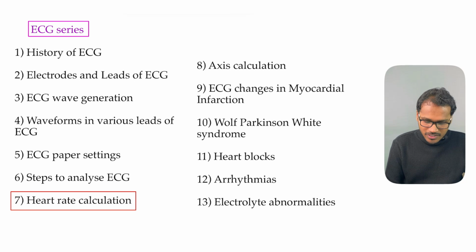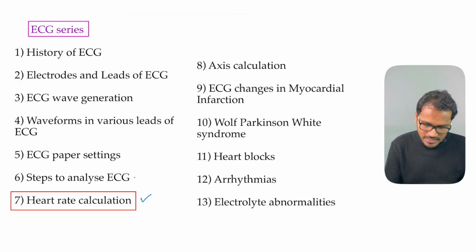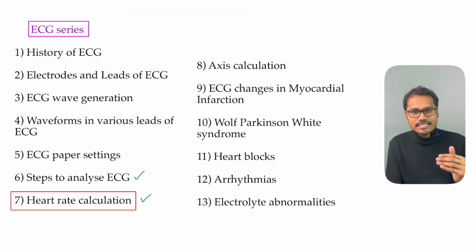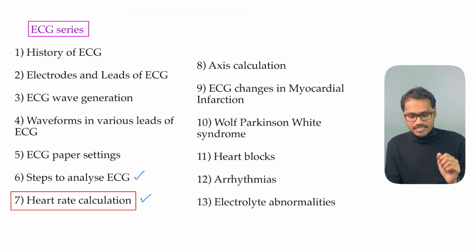Today in this video we are going to calculate the heart rate in an ECG. So this video is all about the heart rate calculation. In the previous video we have seen the various steps of analyzing an ECG, and out of them calculation of heart rate is an important one. So in this video I will tell you how to calculate the heart rate using a simple ECG strip.